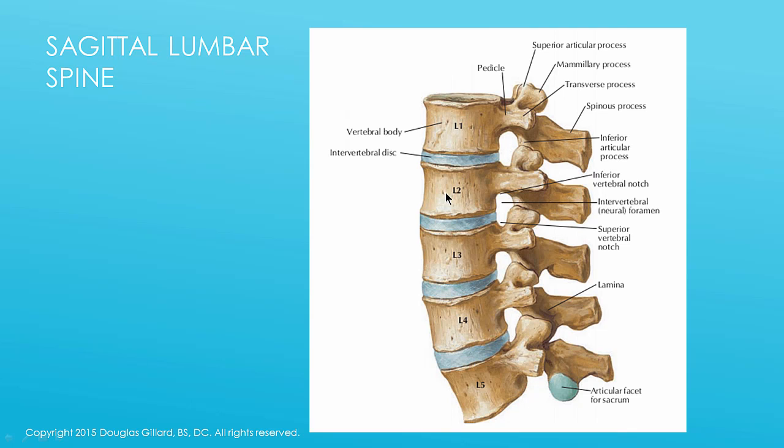Vertebral bodies are here. What's this vertebra-disc-vertebra combo? Good, motion segment. This is the L2-3 motion segment. What hole is this? This is the L2/3 neuroforamina, because it's both of them. These are the discs, of course. So there's an inferior articular facet there.